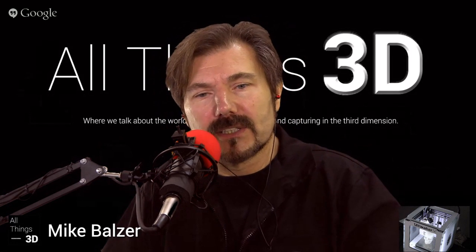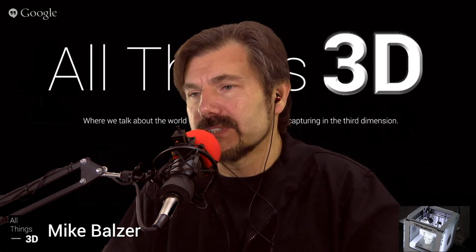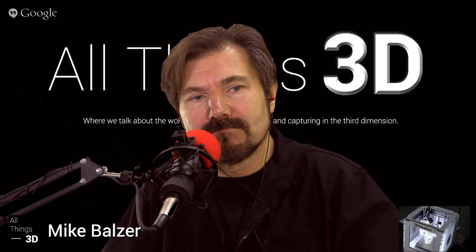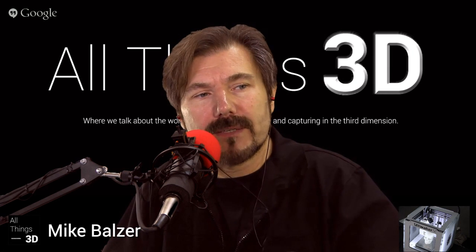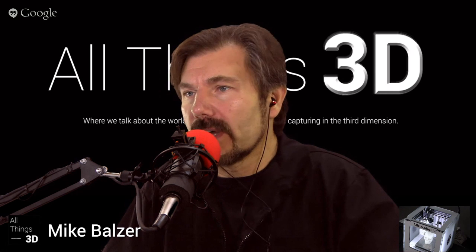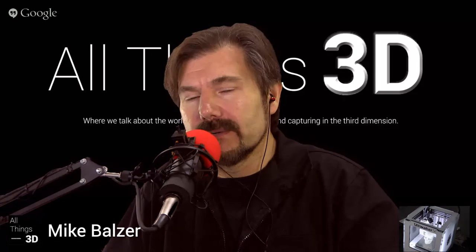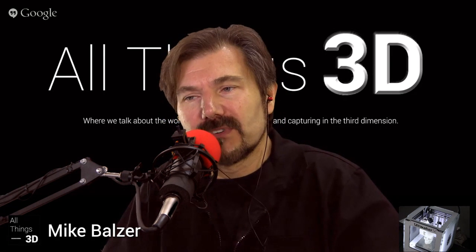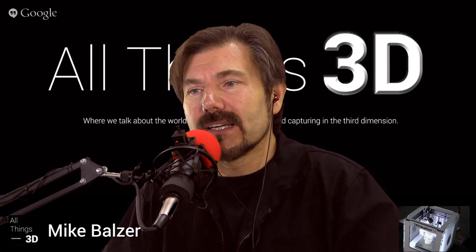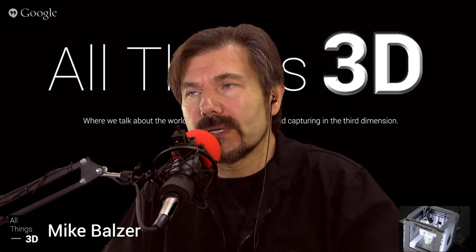and we're going to go through a brief tutorial on a product called 3D Slicer, an open source scanning software tool that allows you to create tangible models as well as what they call 3D volumes. We're going to go through that, and then we're actually going to go through the entire process of getting a model to a printer. In fact, I have my little trusty Ultimaker here. I don't know if it'll be up for the job. I'm still tuning it, but we'll at least get there. I do have a model that I created earlier that we'll be able to pull off of it.